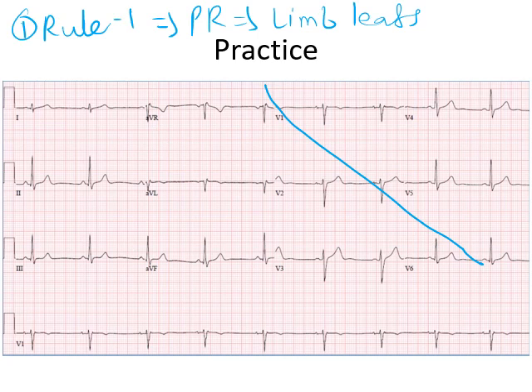So I want to look in lead 3 for that matter. Say here PR interval begins and it ends very well before end of one large box, which tells me that this is a normal PR interval. In a sense, this ECG, if you look for other abnormalities, they are absent. So in a sense, this is a normal ECG.